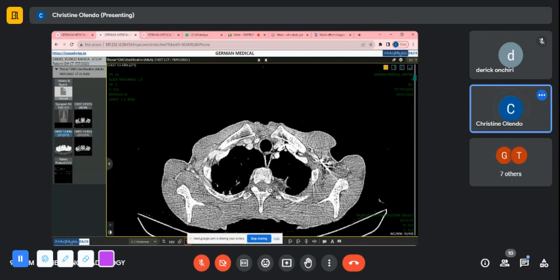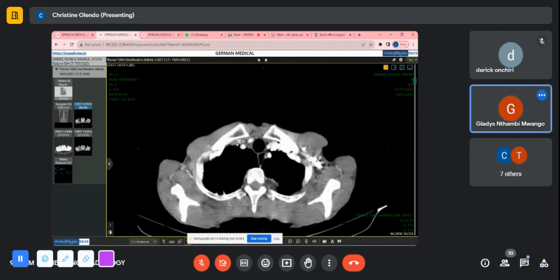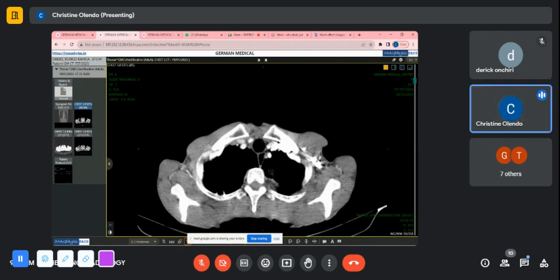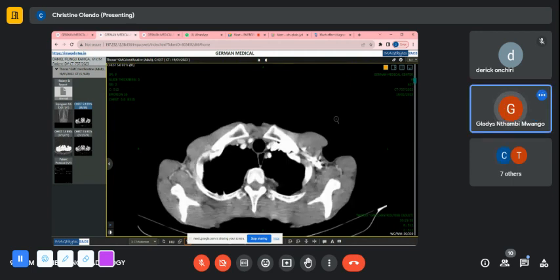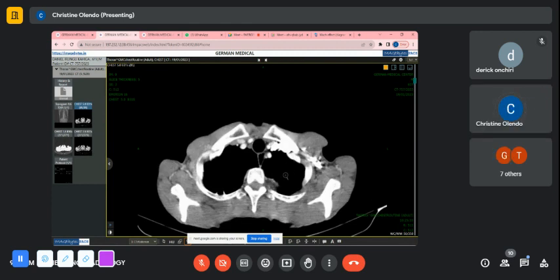Yes. So that's esophagus, it's just air filled, right? Where is the mass on the esophagus? And why did they do a lung window? Why did they not do a CT chest with contrast? They did. Oh, here you are. Then yes, there you are. Yeah, right here. Okay, and I think that's what Talen was asking about. Yeah. There's a mass there, but it doesn't look like it enhanced. No. And it looks like it could be fat then.